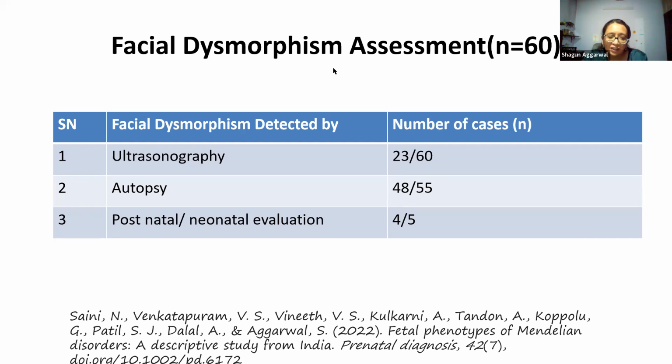But then again, as geneticists, we do like to look at this because postnatally we see children and adults with dysmorphism. So in the scan also, often we can appreciate these features. In fact, we have recently published this work, and this is what Dr. Neelam's thesis was on, where we did a scan and then followed up these cases.